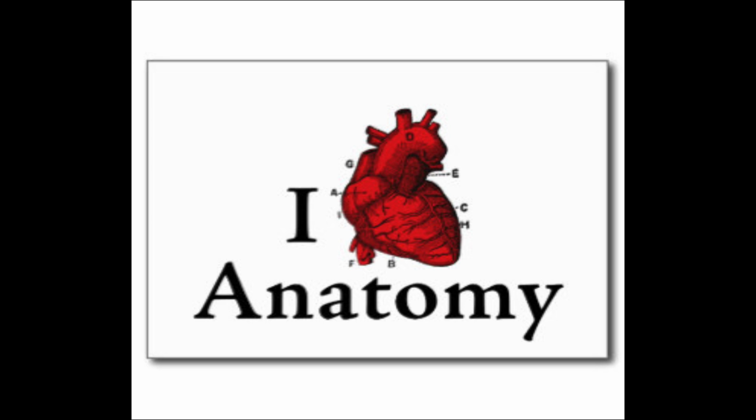Now, I hope you've enjoyed this video and learned something about cardiac anatomy. In future episodes, we will discuss pathology as well as some more anatomy and techniques in detail.